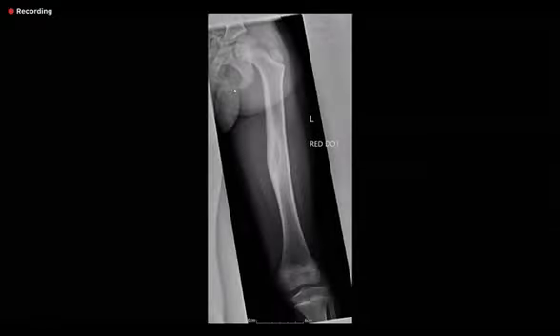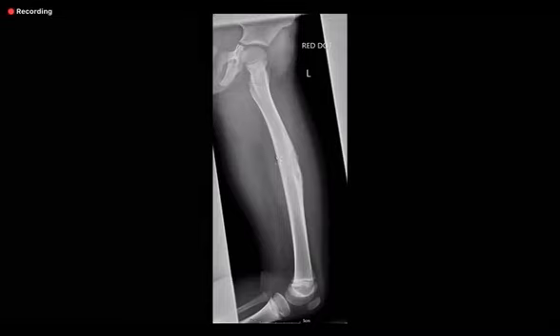If you see here, the point is to look at this lucency. This lucency is not like a nidus. So it is fine, because this is a solid type of periosteal reaction. One might think it is because it is cortical based, but the shape of this is not like a nidus. Having said that, on the first film, it's a tricky one. But on the second film, it is diagnostic.